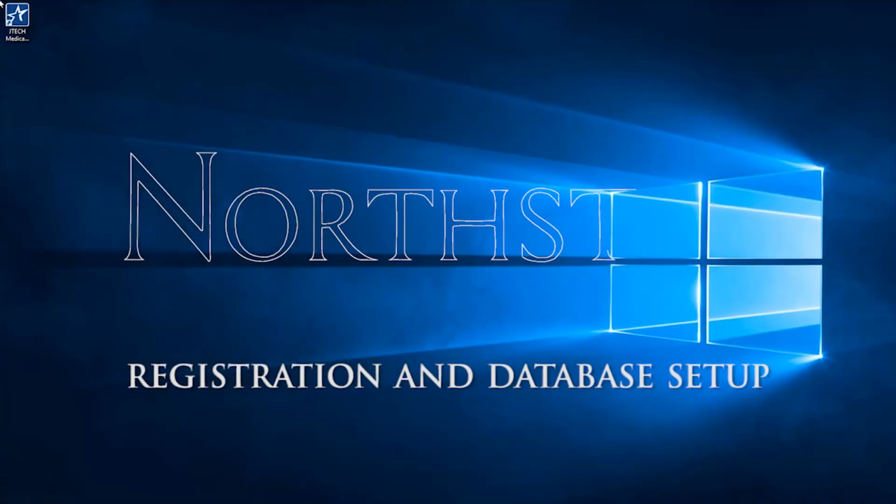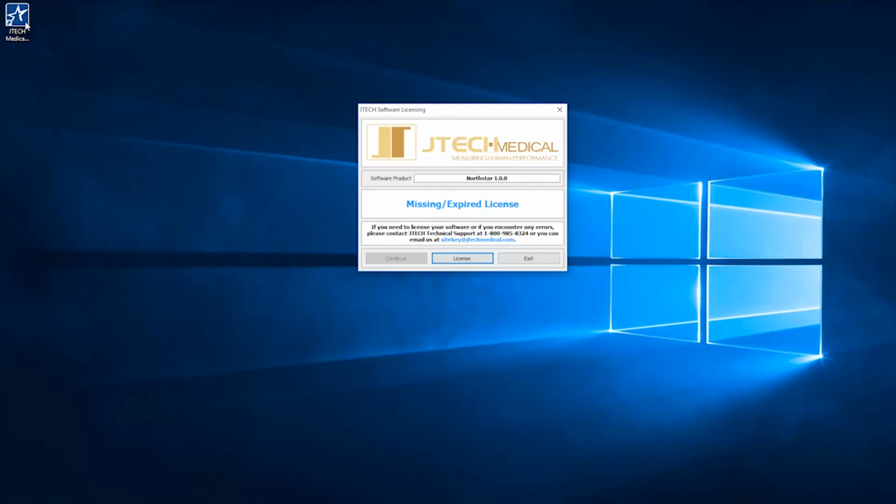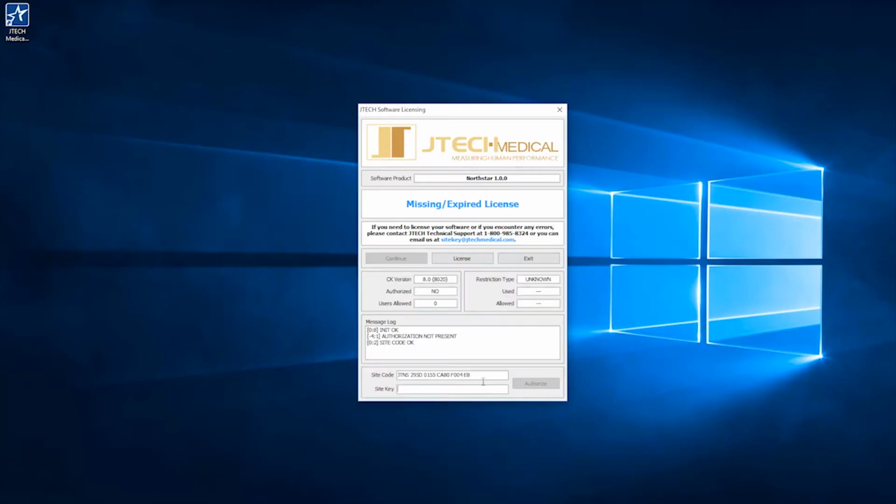Before using your software, you must contact JTECH customer service to register your software and receive an activation key. First, open the JTECH Medical Northstar software. Next, locate the registration site code. Contact JTECH customer service using the information you see on the screen.